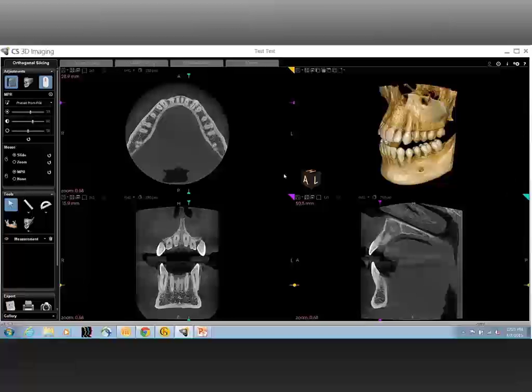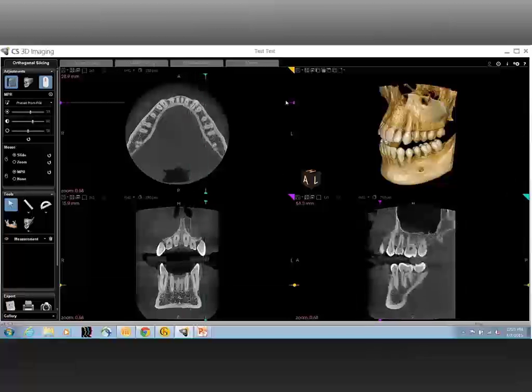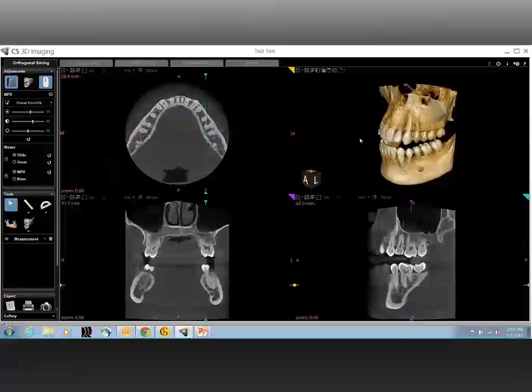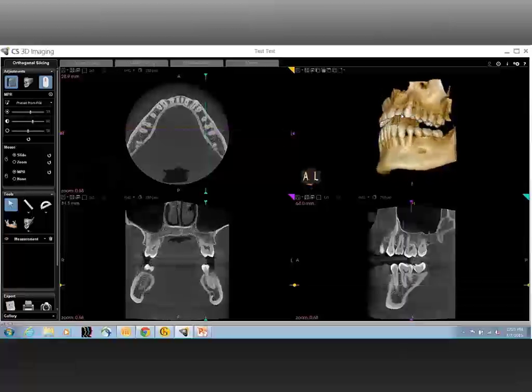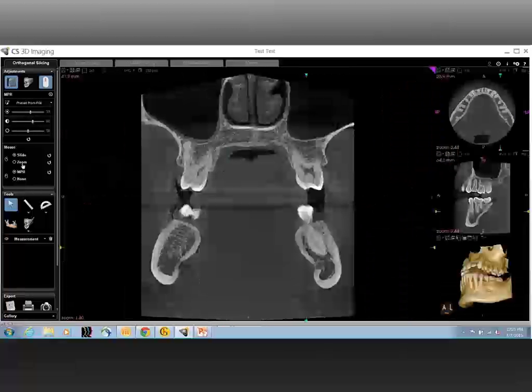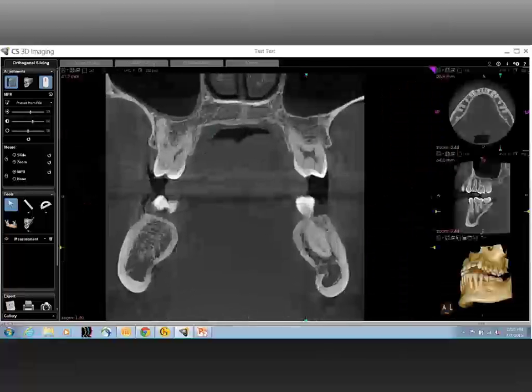Jordan, there are, of course, many important structures, but for the sake of a quick Q&A session, I would limit or list out a few structures that are absolutely important while reviewing a scan. In the mandible, or just as in any bone, a few things are to be noted. Number one is the cortical bone. The cortical bone by itself acts as the margin of the mandible. If you notice, as the cursor indicates, the cortical bone is thick, pretty prominent, and forms the margin of the mandible.